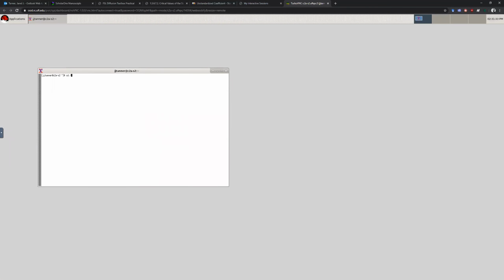The first thing I like to do is get to the location of the data. So CLP7934 share, homework data, and then I'll go into my folder and then TBSS. Within there, I type ls and we see 3 folders and 2 files. The 3 folders are FA, which was created and has almost all of the processed files. Orig data has the original FA files.